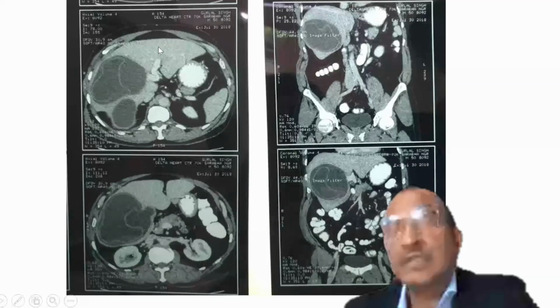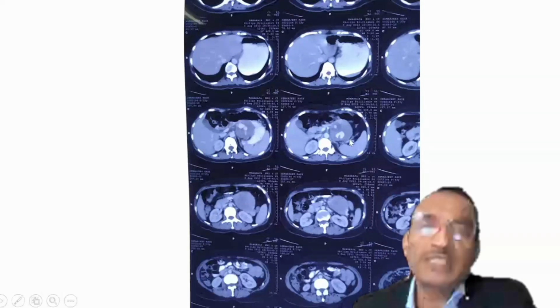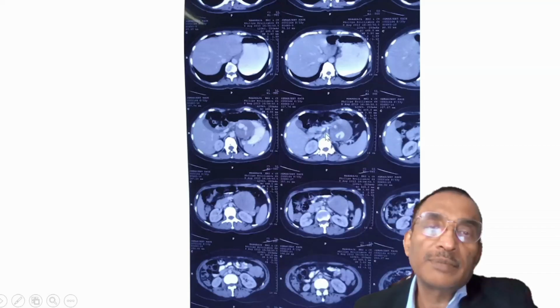And then what we are seeing, this is stomach, this is liver, and towards the lesser curvature of stomach, we have a SOL, and this SOL appears to be relatively fluid filled, so cystic cavity. So obviously in this area the commonest lesion will be walled off pancreatic necrosis. But interestingly, what we see here is a very dense structure inside, that there are actually two dense structures which seem to be communicating with each other, and its enhancement pattern is comparable.